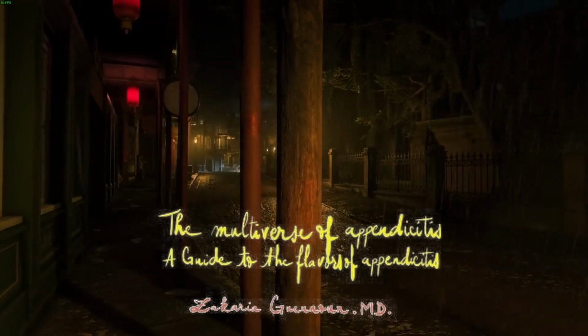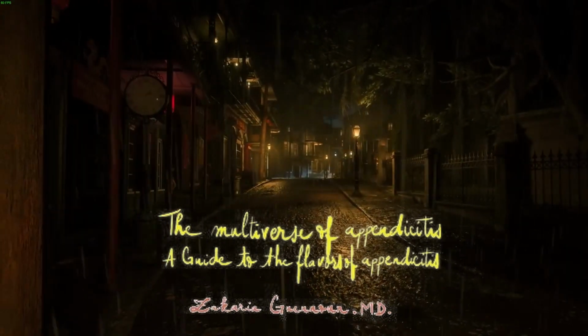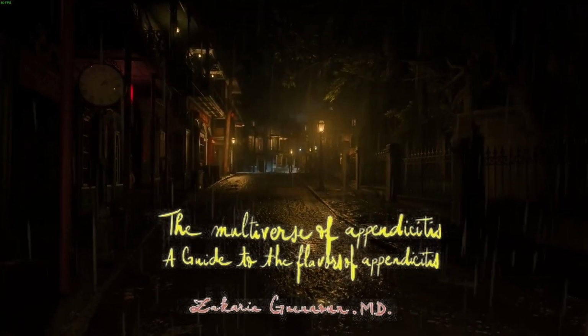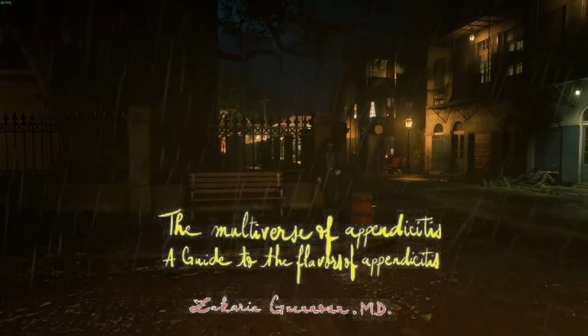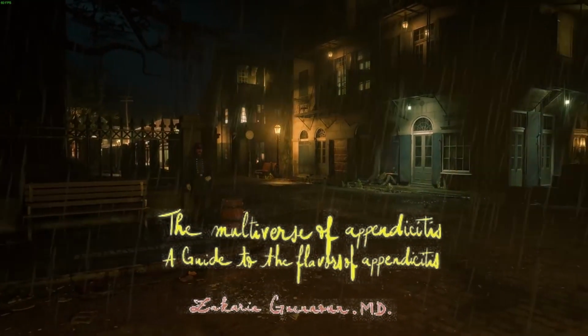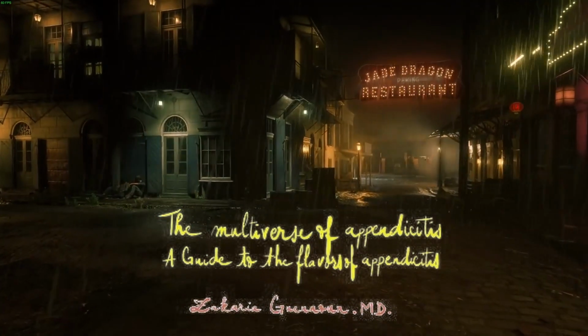Also, there are some things that are usually found inside the lumen, which will be found now outside of the lumen because of the perforation, such as extraluminal appendicoliths, extraluminal gas, or even extraluminal contrast if you are brave enough to also give iodinated contrasts orally. And if you're lucky, you'll be able to see wall enhancement defect.